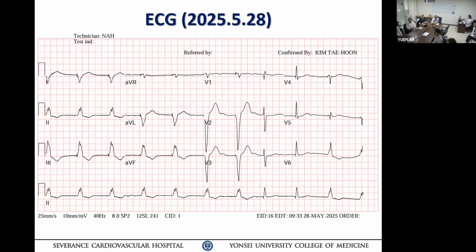Now, what is happening here? You described it very well. Narrow complex mixed with the pacing going on here. So is this pacemaker rate regular or irregular? First of all, what do you think? Somebody needs a caliper here to measure this. If you measure the RR interval and it is fixed and stable, then this is perhaps a fixed-rate pacemaker at baseline. But if the RR interval shortens gradually, this is a rate-responsive pacemaker.